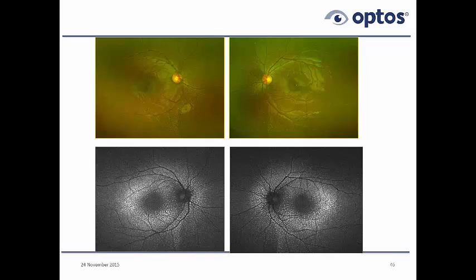But with practically the same magnification, we're looking at the autofluorescent images, and we see these remarkable dots. Fundus albipunctatus has a lot of these dots. They're very uniform. One dot looks like another dot. And usually these patients have difficulty seeing at night. By definition, it's a congenital stationary night blindness. So they're born with it.